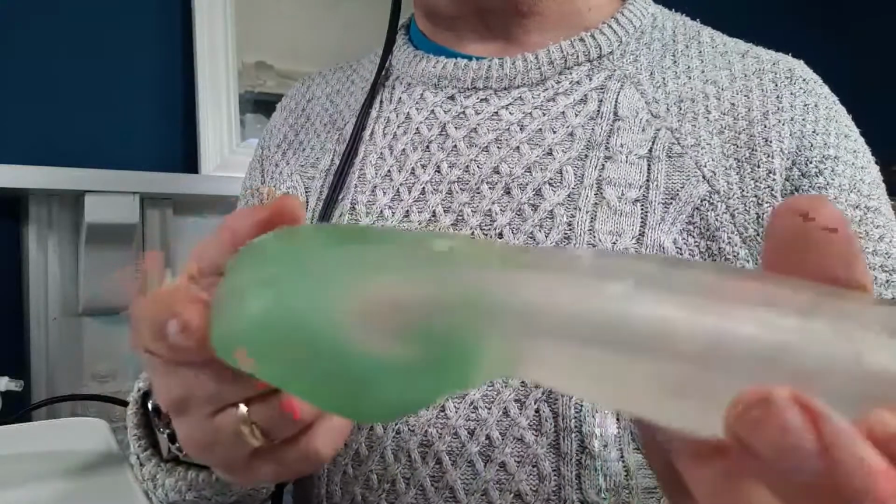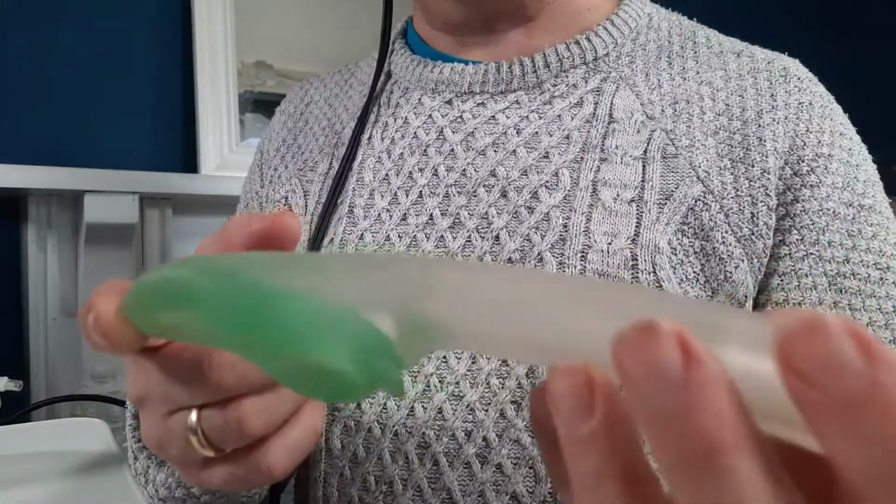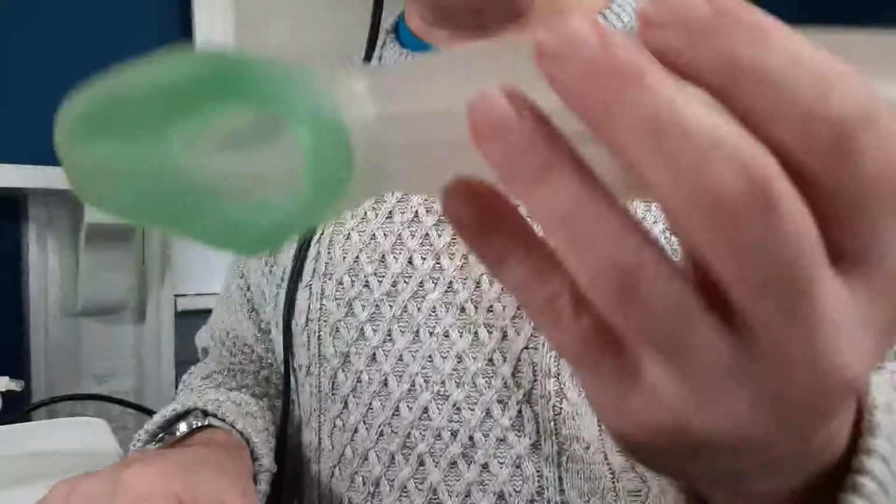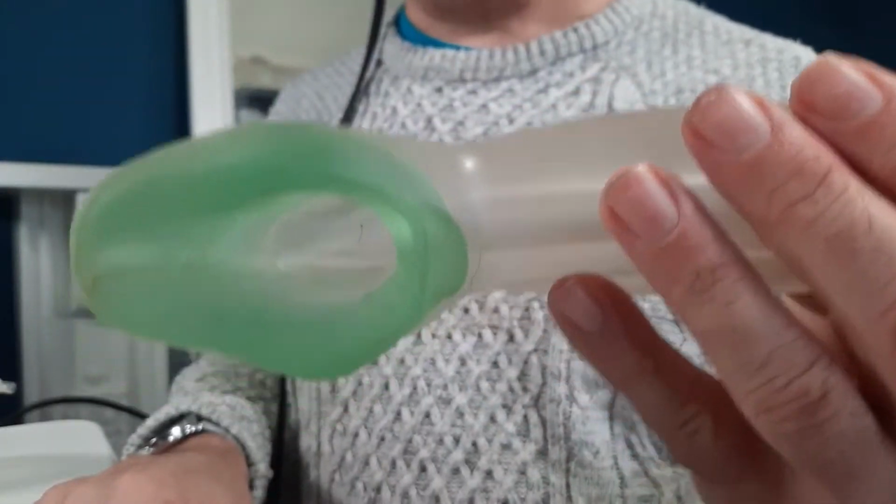and hopefully it will sit in the right position. This doesn't have a balloon like the old ones used to. The old LMAs had a balloon, these don't. They're just made of this plasticky, quite flexible substance, so you won't need to inflate these. Hopefully you won't need one of these. Hopefully as well you're not going to go to Plan D.